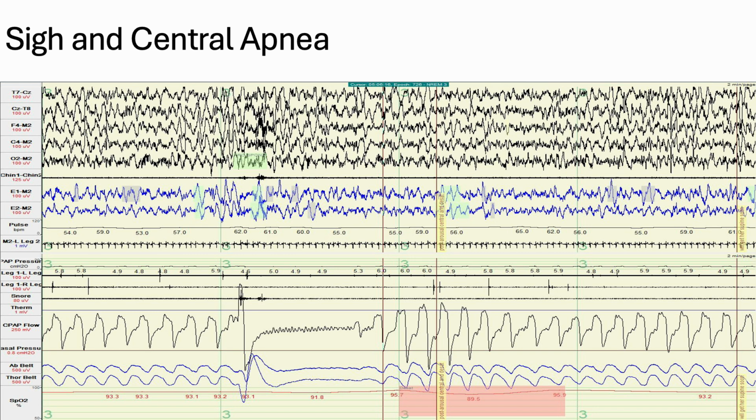I have a personal rule for scoring onset centrals. If they happen 3 times in a row, I start scoring on the third event and all the events afterwards. It's kind of arbitrary, but it was a consistency thing, that a lot of patients will have 2 and then they'll get over it and go on. So on the third one, I would start to do it. And I would also document why and when I started scoring like that so the doctor knew what I was doing.